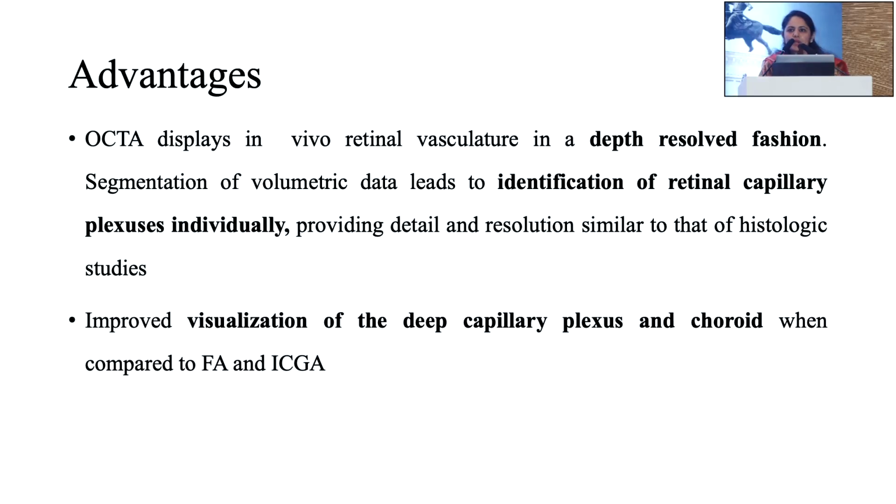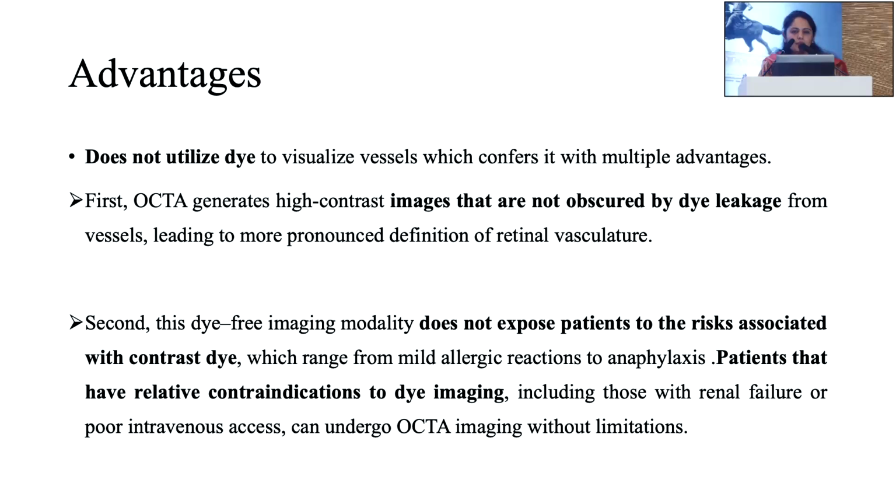Plus, because there is no dye leakage, there is no obscuration of the retinal structures. Also, it not only images the superficial capillary plexus, but the deeper capillary plexus are also imaged, and there is a better visualization of the choroid.